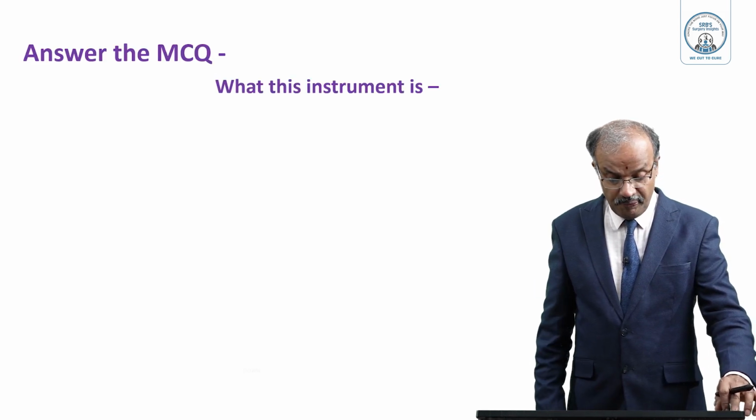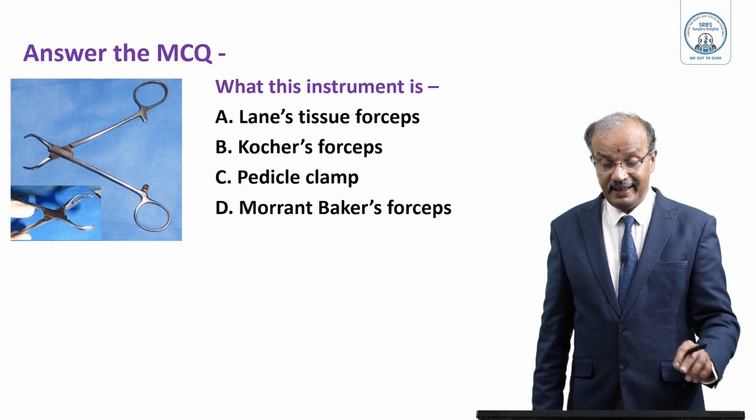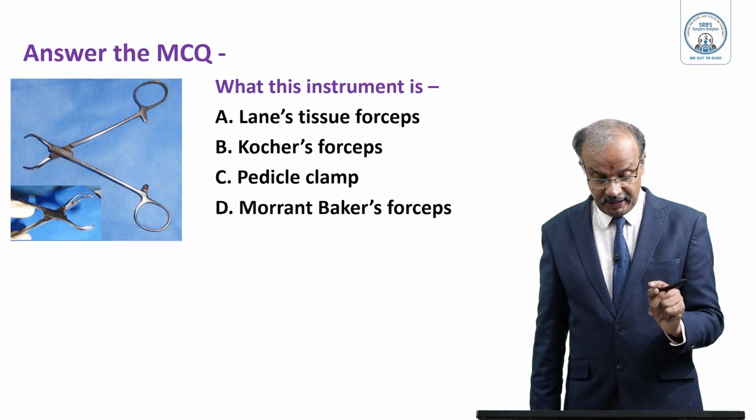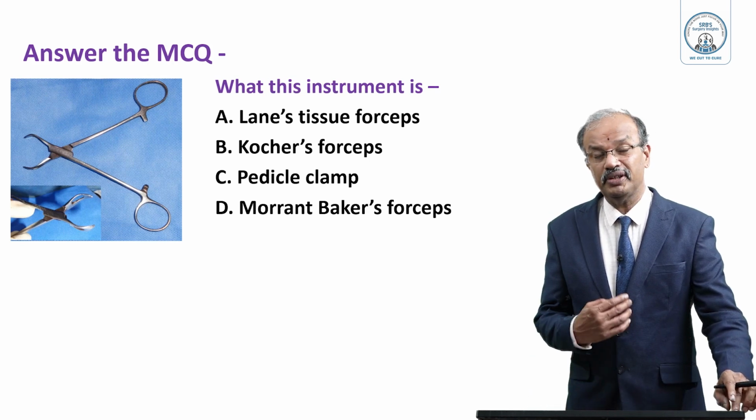So answer the MCQ. What is this instrument? Look at that. A. Lane's tissue forceps. B. Kocher's forceps. C. Pedicle clamp. D. Morant-Baker's forceps. So put your answer in the comment box, students.